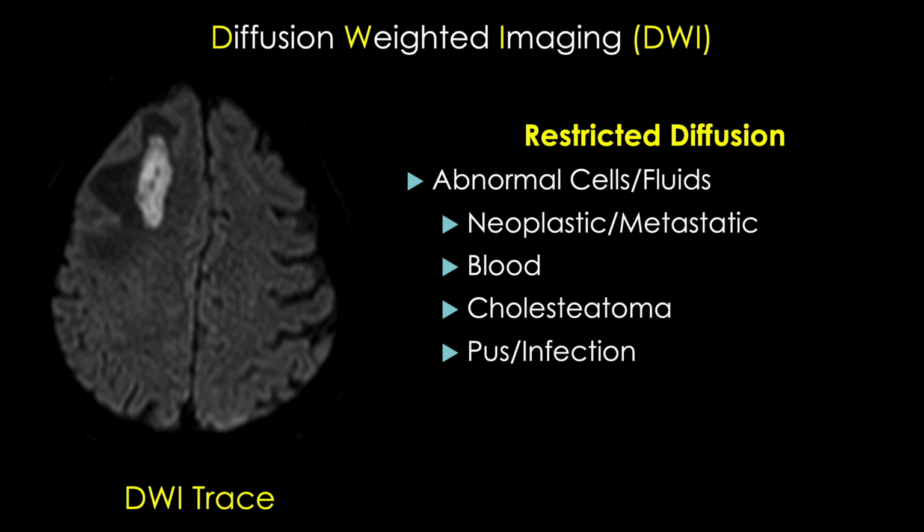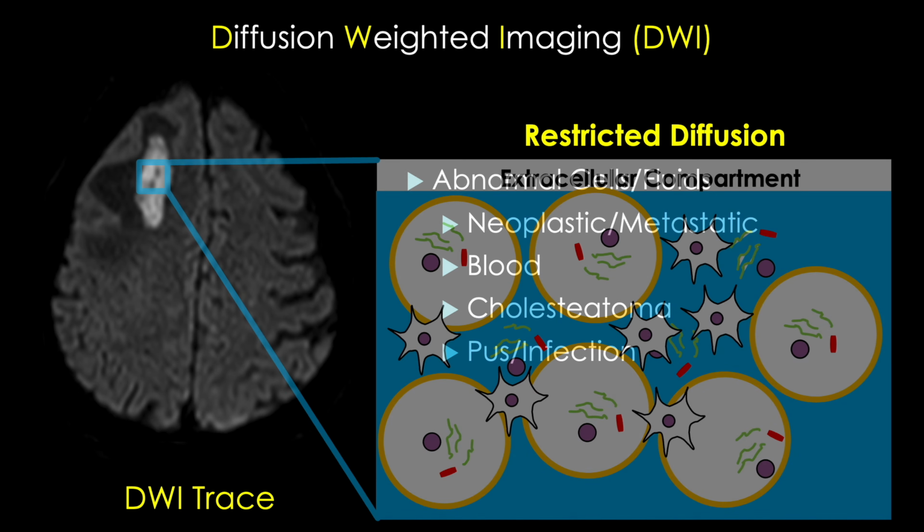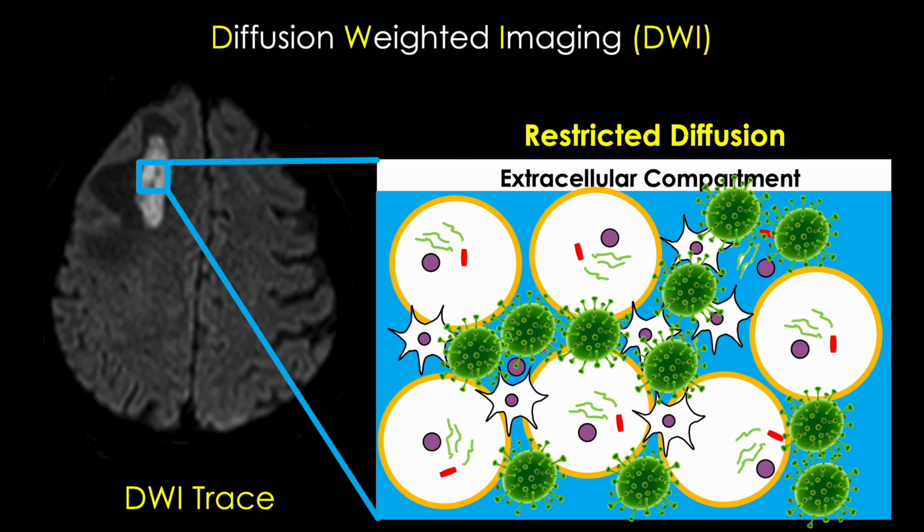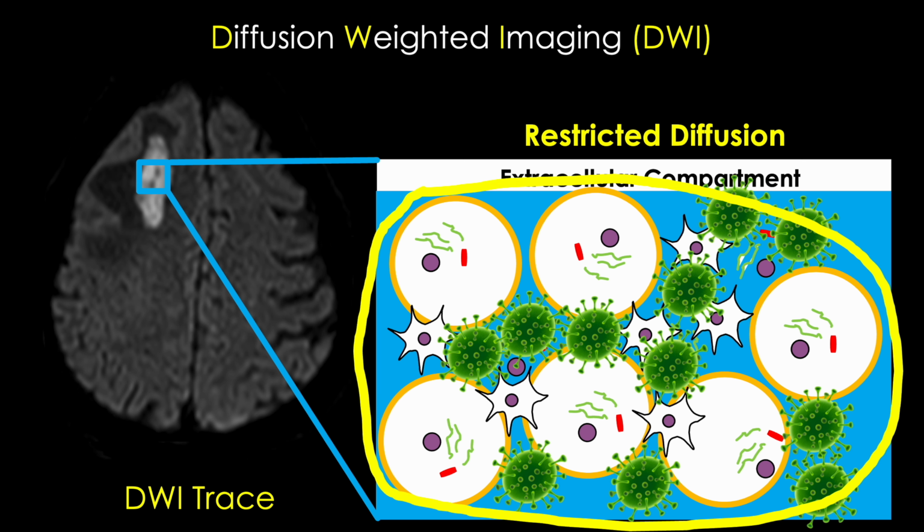Now be warned, there are other neoplastic and autoimmune etiologies that can show peripheral enhancement with central necrosis, but those typically don't have pus filling in the cavity causing such prominent restricted diffusion throughout, as seen in this abscess. As to why this causes restricted diffusion, again, we have products of inflammation, but this isn't just our own cells being attacked by the immune system as before. There's abnormal bacteria growing, destroying cells, and being destroyed themselves, creating one big mess that the body tries to wall off, leading to the formation of this abscess.